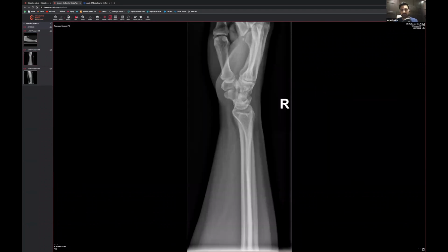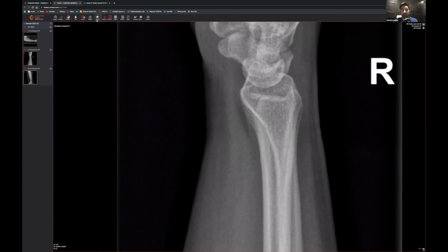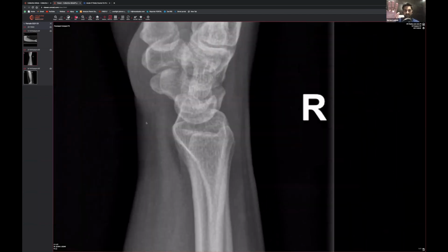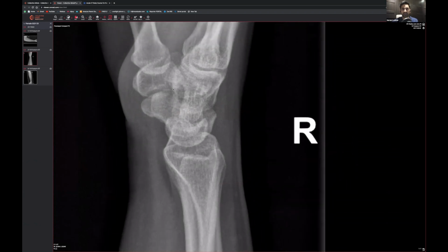And then also on top of that, we do have a bit of a wrist image here. So you do have to kind of zoom in and make sure there's no distal radial fracture, because after all, the only way that fracture may have happened is because they've literally fallen on the hand. There's been a translation of forces through the forearm, hitting that radial head and resulting in that impaction fracture. And that can only happen if you've had this sort of impaction over here. So very, very important to have a look at the carpal bones.